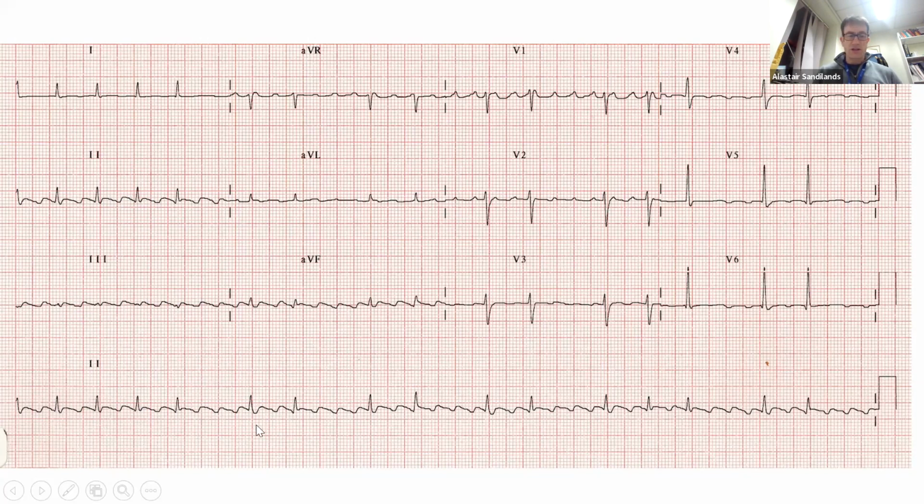But now if you look along the long rhythm strip, you can see the variable conduction to the ventricles. So here the conduction is 2-to-1, and now it goes out to 4-to-1, back to 3-to-1, 4-to-1, 2-to-1, 4-to-1. It's changing, so it's variable conduction because of how the AV node is working at this particular point in time. So at this point, the AV node recovered, it goes there. This one takes a bit longer to recover, and then there's the QRS conduction to the ventricle. So this is just an example again of atrial flutter, but it's trying to prove the point of variable conduction to the ventricle, as evidenced by a regularly irregular QRS, but a narrow QRS nonetheless.